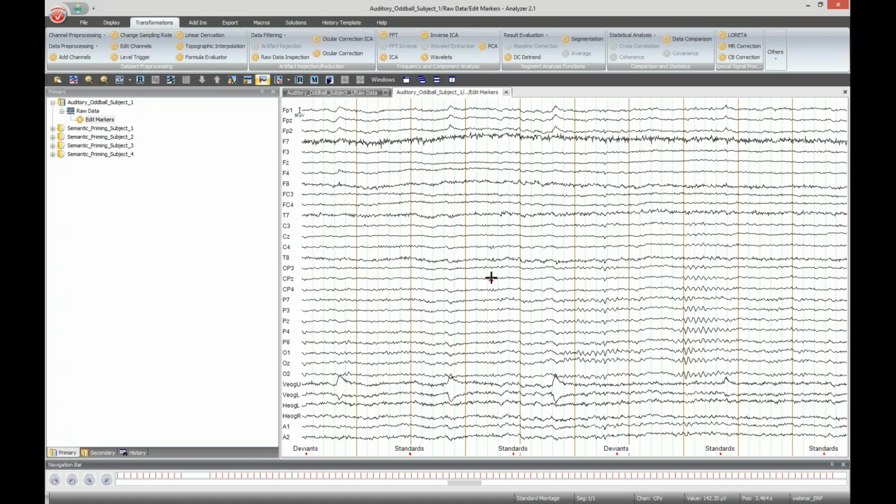Lastly, we want to keep our analysis tree tidy and telling, and therefore I recommend to edit the name, because always these default names are given. So I usually stick to the default and just enter a suffix in the end, for example, and I will call that rename S21 S22, because now I see on first sight what I have done in that node.